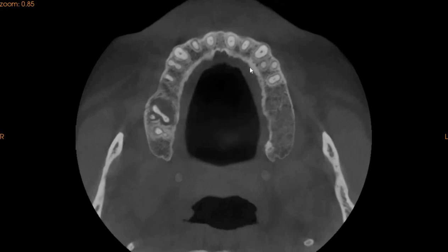And if we measure it on the transaxial view, we will even place an implant so that an idea can be given on how a virtual tooth replacement can be done. As far as the upper right second molar is concerned, this tooth will definitely need to be extracted, and vertical and horizontal bone augmentation will definitely be needed in this case.